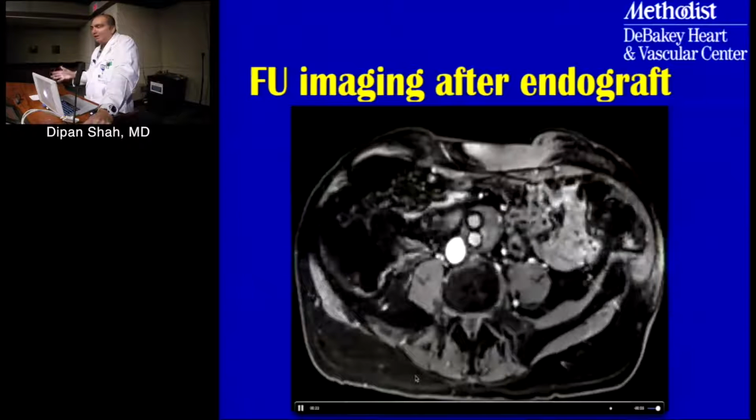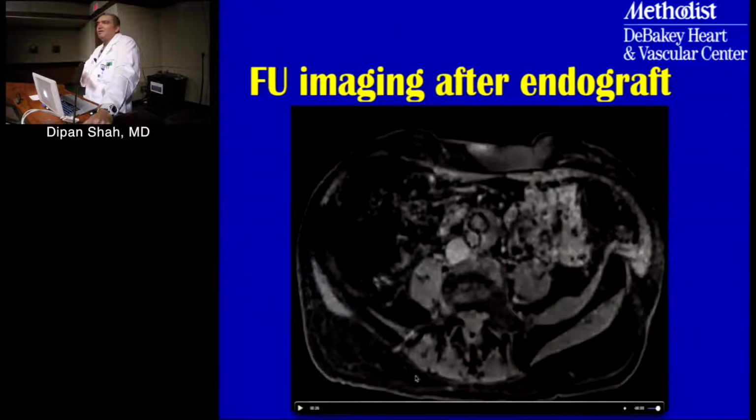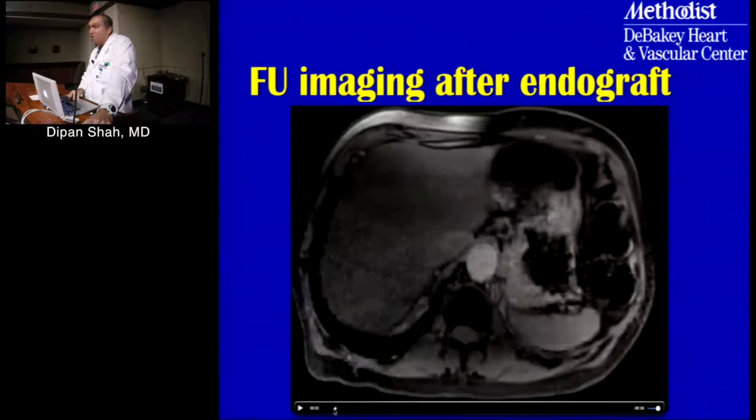Okay, so generally speaking, migration of these endografts is pretty unlikely to happen nowadays, aside from maybe the very acute period. So maybe on your initial imaging, make sure that the graft is placed properly. But on serial follow-up imaging, it's one, presence of endoleak, and two, the size of the aneurysm sac, right? Because they still have an aneurysm sac in place, and what you want to see is that the sac is not continuing to get bigger after your intervention. You want to see it stable or ideally getting smaller. And you ideally want to see that the aneurysm sac thromboses off.